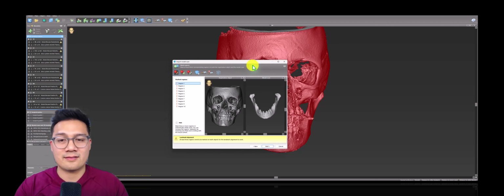So the nice thing about this is in this specific application, instead of using screws or leaving some teeth during the surgery or after the surgery for the scan, you can do the full surgery, and we're using the entire mandible and merging it to the entire mandible in our pre-op CT scan. And so we've actually got literally unlimited amount of registration points. And so the registration ends up being more accurate, and that manifests itself in a more accurate bite when you deliver the temporary final. So I hope that helps.